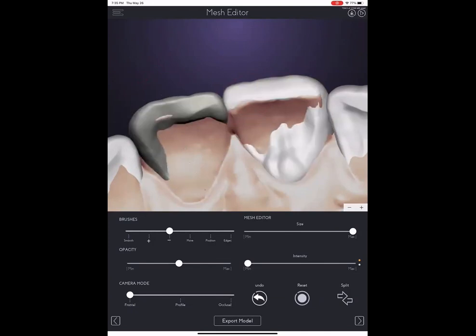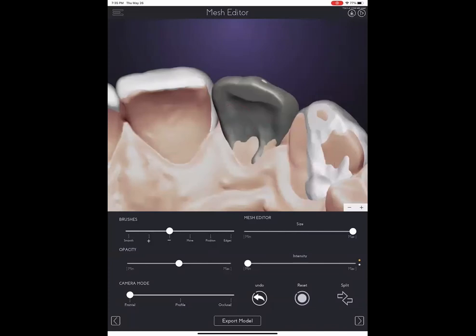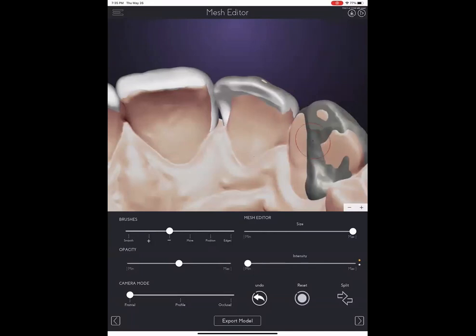Look at that. You get your Apple Pencil, you become an artist, as a lot of doctors say, and you remove all the excess. That way your workflow becomes faster. You're just removing all the excess that you would remove anyway in your patient's mouth. You do the mock-up trial in your patient. With the mock-up in mouth, you do any final functional adjustments that are needed, okay?